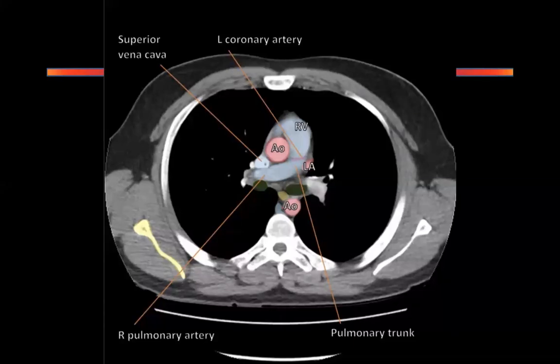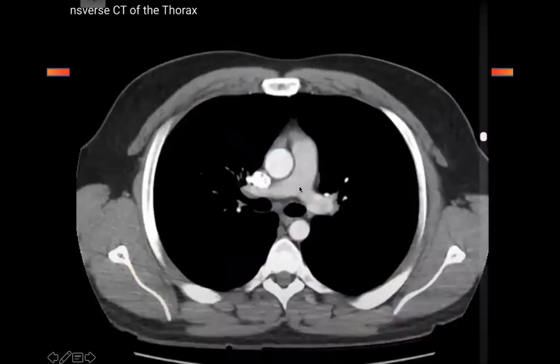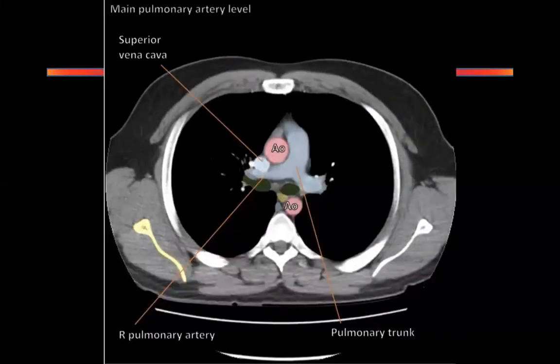Did you just appreciate that? Look at the pulmonary artery. Just concentrate on that. Forget the RV. Concentrate on the pulmonary artery. We are coming from below up. So the right pulmonary artery has already formed. The left bronchus is here, and the left pulmonary artery is coming above the bronchus. Can you see that? Yes or no? Is it making sense or is it too complicated?